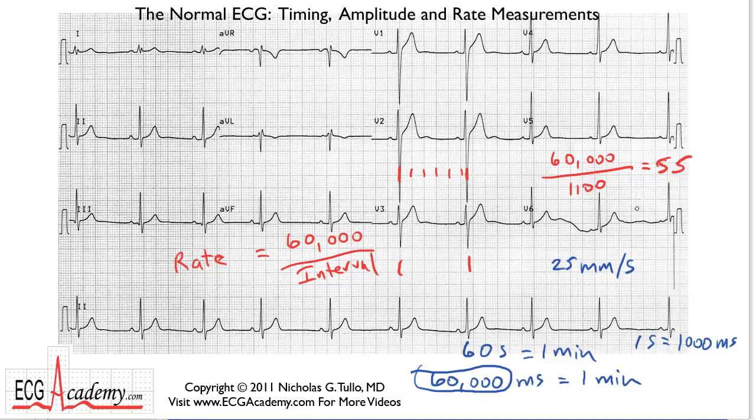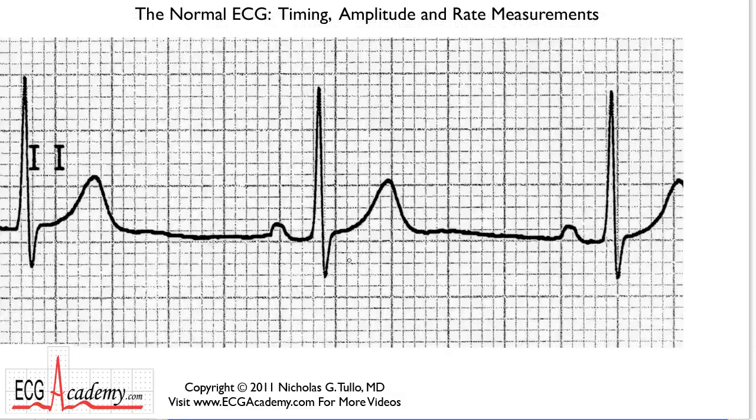And it's easy, right? You can do this in your head, can't you? Well, most people can't, so don't feel bad. There are other ways of figuring out heart rate, and most of it depends on how many milliseconds there are between beats. Let's zoom in on one of these leads here and try to figure out what the rate is. You can count backwards and you can count forwards as well. Here's a P wave that lands on a heavy line, and you can count backwards if you like and count milliseconds: 200, 400, 600, 800, 1,000, 1,040, and you can plug that calculation in.